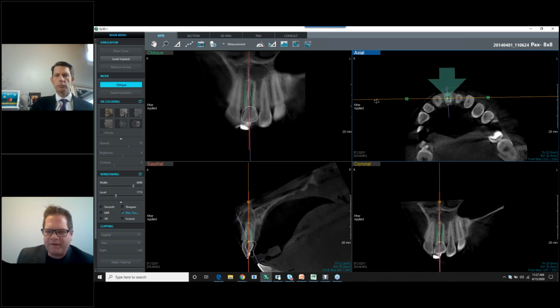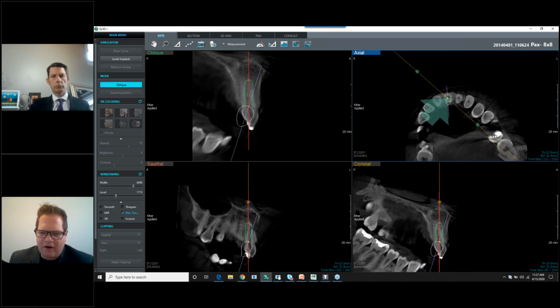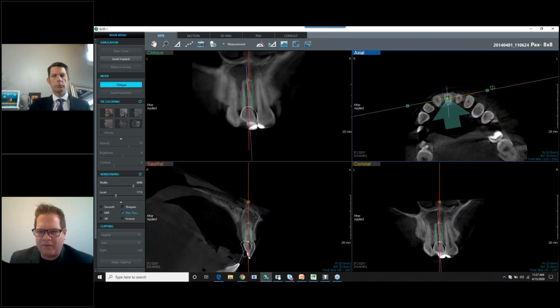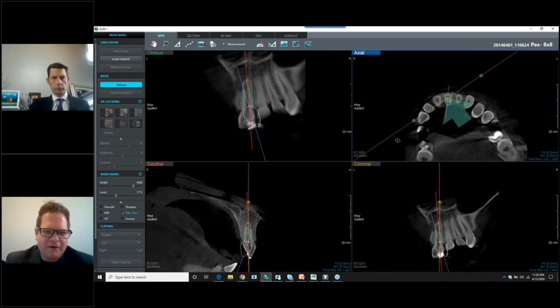You can click that and rotate around the fixed point, which is the green dot in the center. In this case, it's the implant. And the arrow is the direction. So it's telling us that in that upper left image, we're looking right now from the lingual side. It basically moves with it fluidly and shows us the direction. We can see that abnormality there very well.